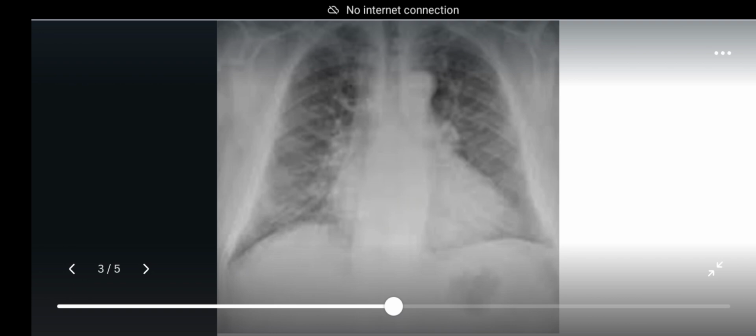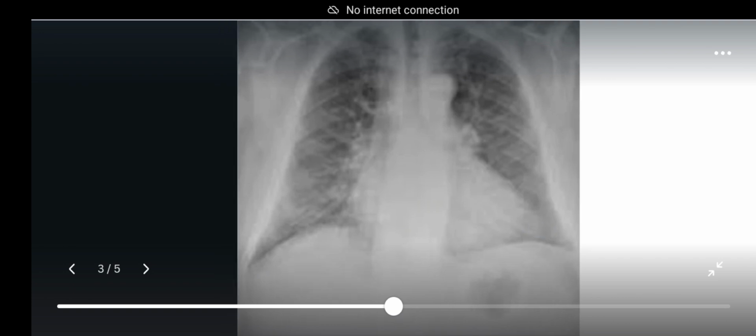And this fluid will tend to occupy the lung bases, these bases. This fluid will cause resistance to free flow of blood in the vessels in this region. That will cause redistribution of blood to the upper parts of the lungs.